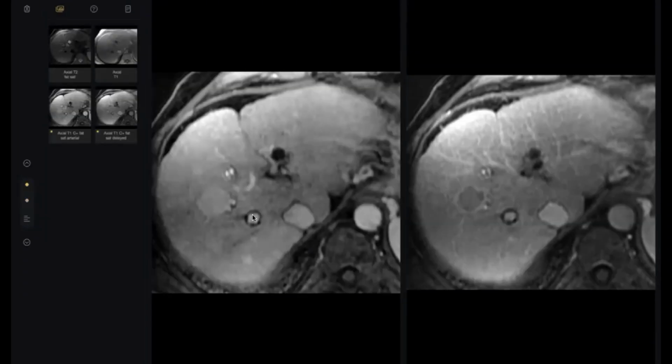Thank you, sir. The patient has a history of TIPS, and this is the tip of the TIPS. What is this? Radiopaedia mentioned this is maybe a lesion, something like this, but I have a doubt because we have a static image. So I talk only about what I'm sure about. This one was HCC. What is your next step, my doctor?